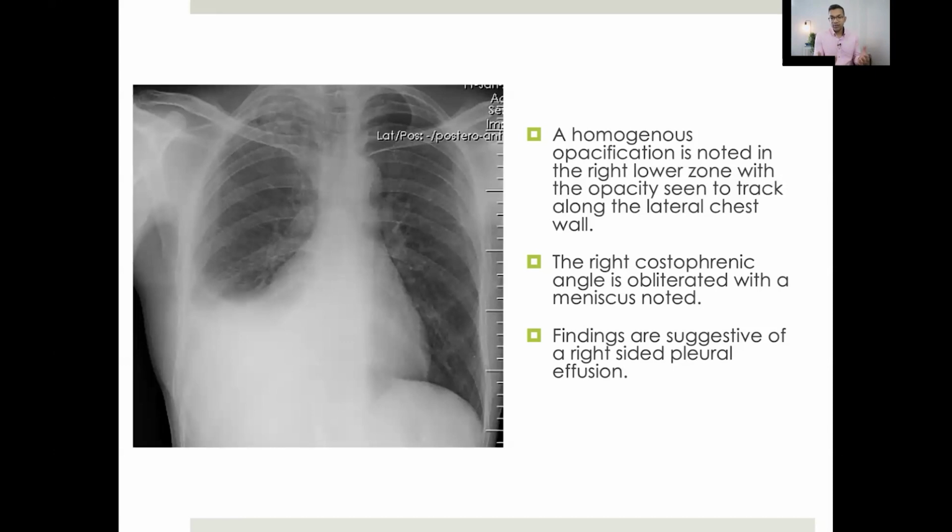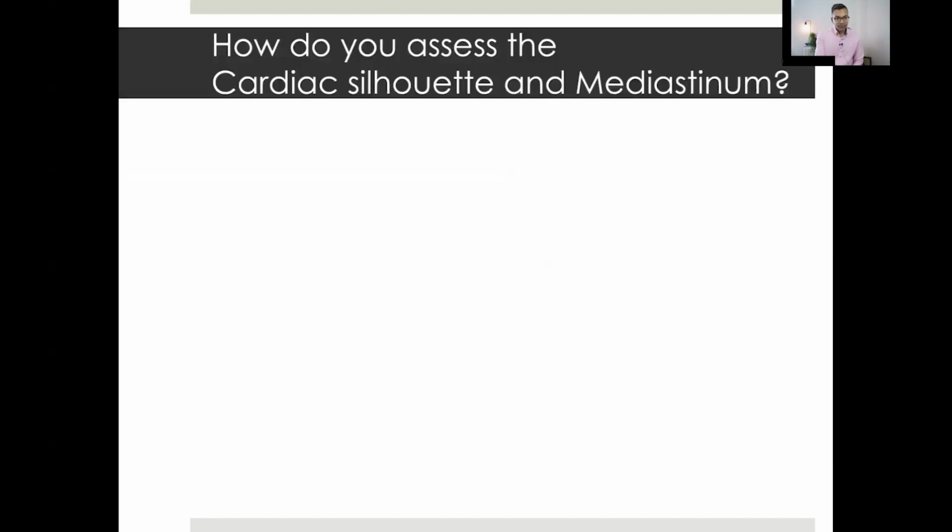That's true. You haven't committed to anything yet. I think I can see a meniscus edge. This could be pleural effusion, or right-sided pleural effusion. So saying things with increasing specificity increases the ability for you to say more true things and less wrong things. Again, because we're not radiologists and we're trying to be as accurate in this game as possible.